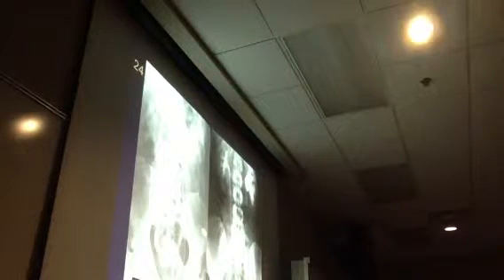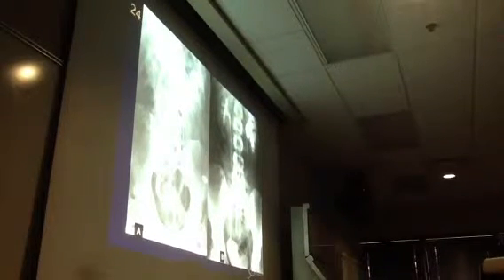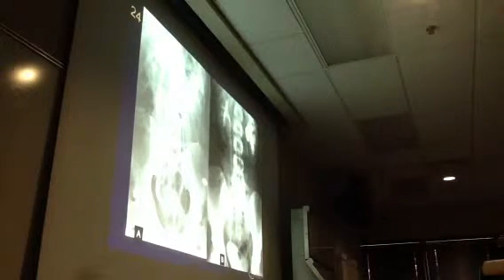And A is a retrograde pyelogram because the contrast is getting through the urethra and the bladder and that way up. It's a retrograde pyelogram. So, like I said, there's probably going to be one contrast question on your lab final, and it's going to be straight definition.